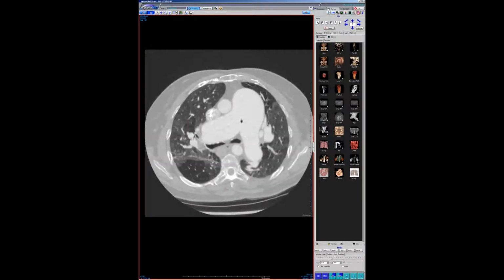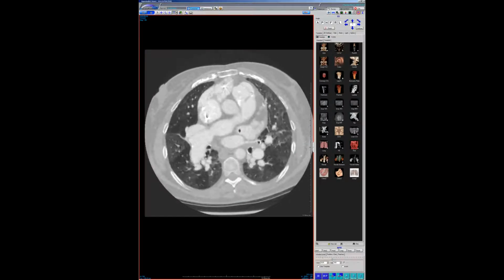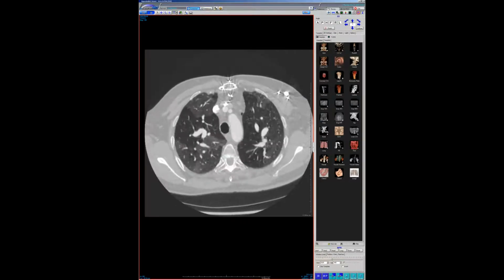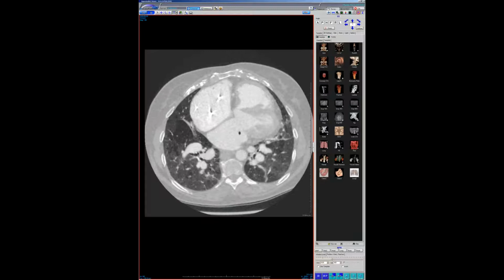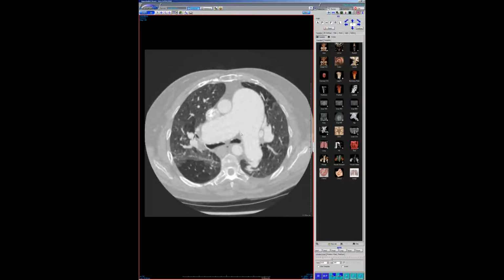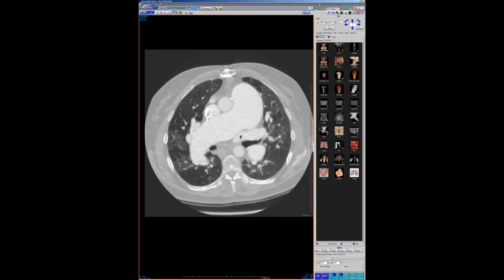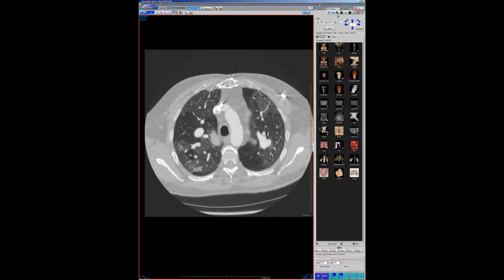The other thing I want to mention, which is really interesting, is this really well-defined geographic pattern of mosaicism, kind of that CTEPH-ish look. I've only really seen it in two things. One is CTEPH, when it's truly vascular in etiology, and the other is long-standing shunts. I have about 10 cases of long-standing undetected shunts, right to left or left to right, that lead to this pattern of mosaicism. You would think it would lead to the typical kind of PAH or other causes, but it doesn't. Why that is, I don't know.